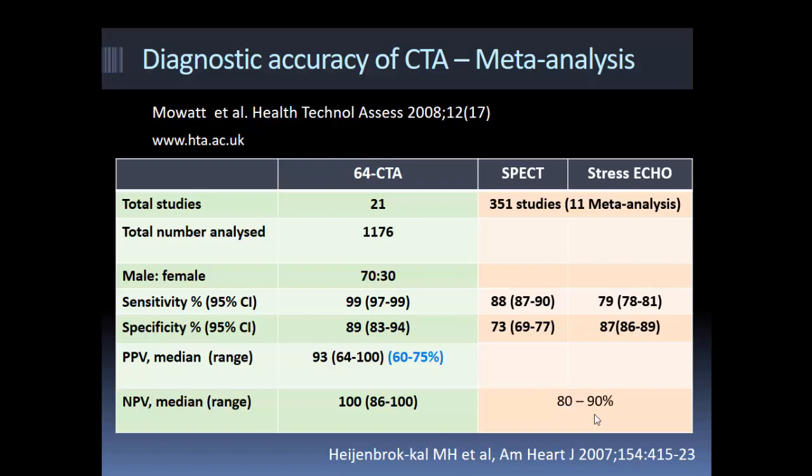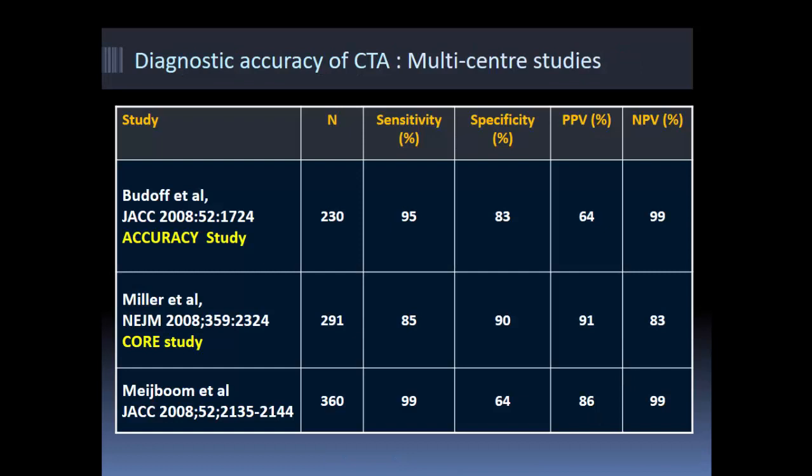This is more than 50% plaques. You will have many more plaques which are non-obstructive, but even obstructive plaques you will have. And something that we cannot miss on CT angiography is left main stem disease and 3-vessel disease. You will always identify that on CT angiogram.